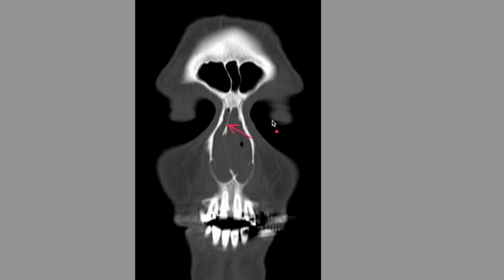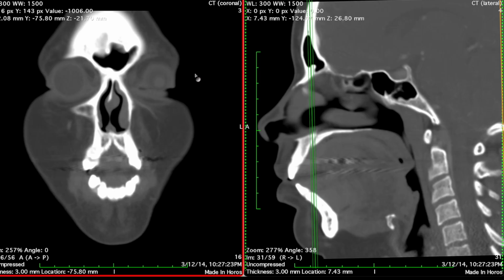The difference between the two is the nasal bones are externally bordering the nasal cavity. They're serving as like the nose bridge, whereas the bony septum is going to appear very thin and sheet-like, and it's within the nasal cavity. Returning back to our coronal and sagittal views to illustrate the bony septum, it is harder to appreciate any sort of division in this area, but you can imagine that the nasal cavity outlined here has the bony septum within it and the nasal bones external to it.